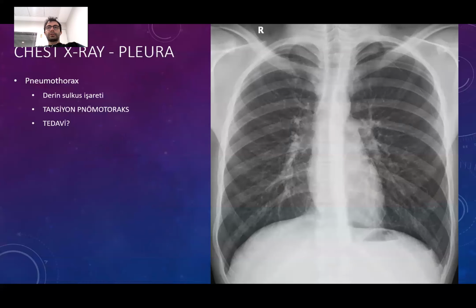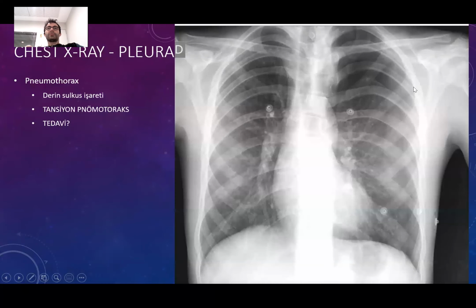Okay, we are late recording again. We were going through cases of pleural effusion and pneumothorax, and in the case of pneumothorax, when there's air inside, the lung is falling down, and we see the border here. Also, one other thing to detect this is that we cannot follow the bronchovascular lines to the very lateral part, where in some areas there is just bones and no lung.